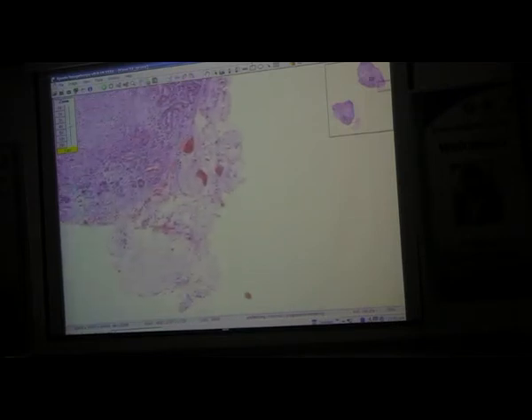Well, first of all, when I look at this tissue, I see this. Fat. Now, the way I like to do this when I'm studying with my students, and you don't have to do this at all, I prefer to call this, just for the purposes of instruction, adipose connective tissue because fat can be intracellular, extracellular, but you're right, it's fat.